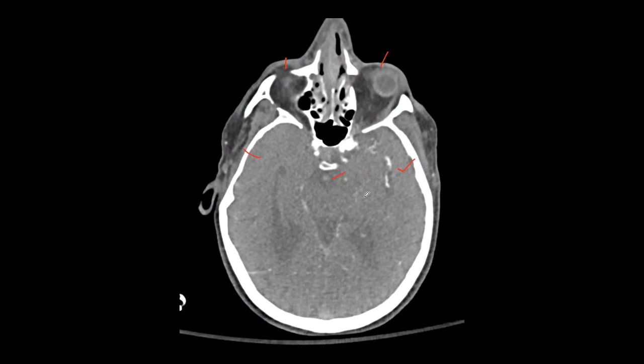Which vessel runs there? This is part of the brainstem, that much we can tell. The reason I have windowed it where you cannot see the gray-white junction very well is because I wanted to bring out the difference between the vessels, the way they were enhancing. So if this is part of the brainstem, what is the major artery that runs anterior to it, supplying it?